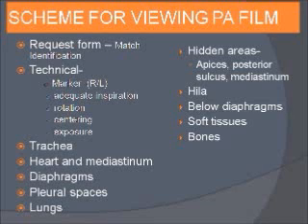So first of all, when we get a chest X-ray, we should match whether this X-ray belongs to a particular patient or not. The most important thing is that before reporting a chest X-ray, we should match the identification number and make sure that this X-ray belongs to that particular patient whose report we are making.